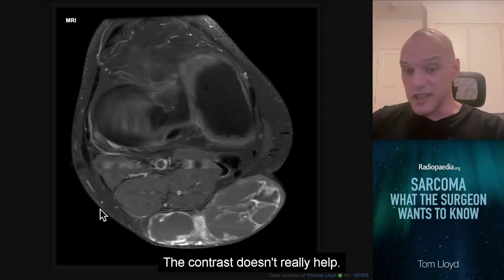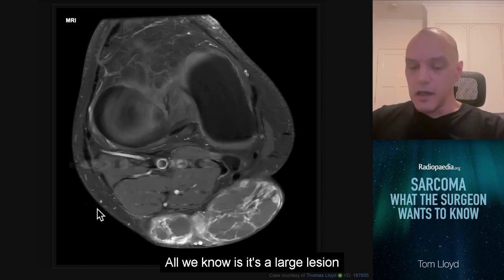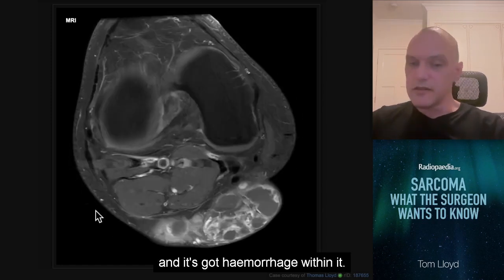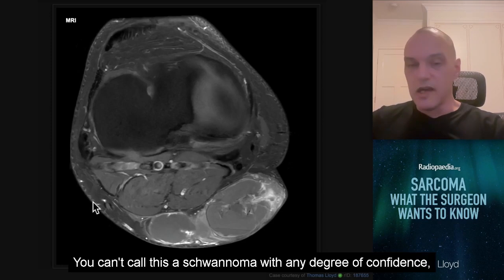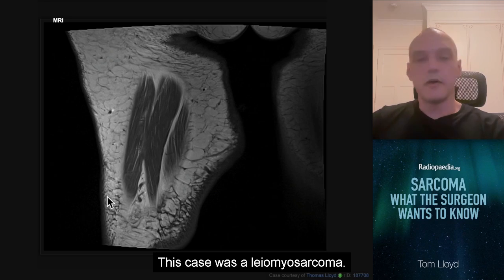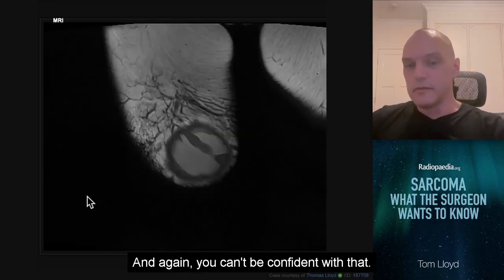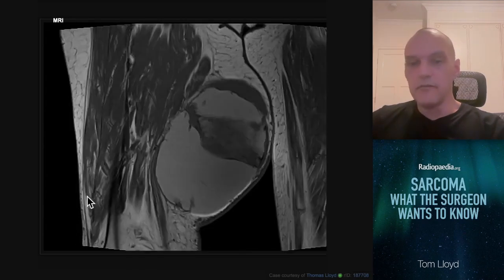The contrast doesn't really help. All we know is it's a large lesion that's contrast enhancing and it's got hemorrhage within it. You can't call this a schwannoma with any degree of confidence, despite the fact that that's what it turned out to be. This case was a leiomyosarcoma. And again, you can't be confident with that.